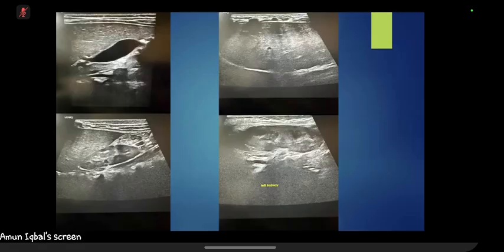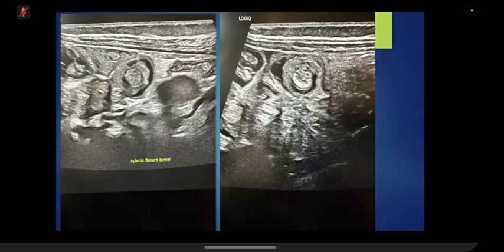Okay, so yes, the accentuated portal markings in the liver on ultrasound in a baby is very common, and it's considered to be a normal physiological finding. Okay, so you couldn't identify the abnormality on these images. I will show you further images. Okay. So there is increased thickening of pylorus. Increased pyloric wall thickening is noted. I will measure it. This is splenic flexure bowel. Okay, so I think there is telescoping of bowel loop with concentric bowel wall thickening, likely in keeping with intussusception.